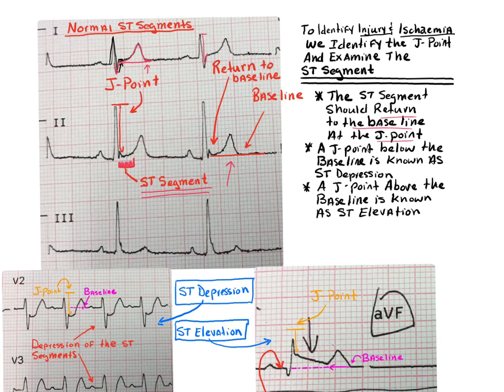If it is below the baseline, that is known as ST depression, okay? The ST segment is below the baseline. It is depressed. You guys good with that? If it is above the baseline, that is known as ST elevation. So below is depression, above is elevation. All right?